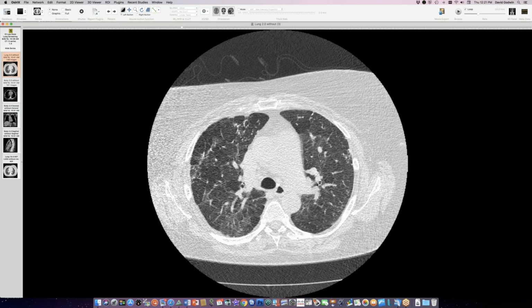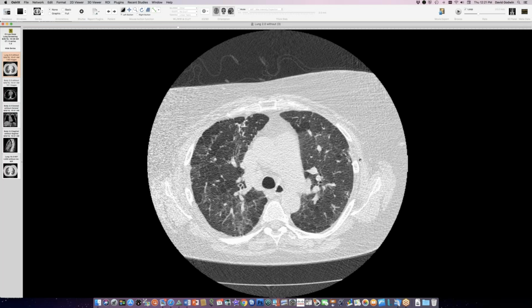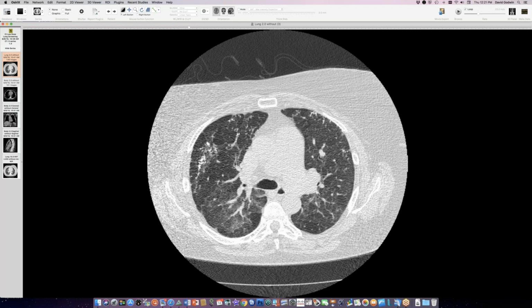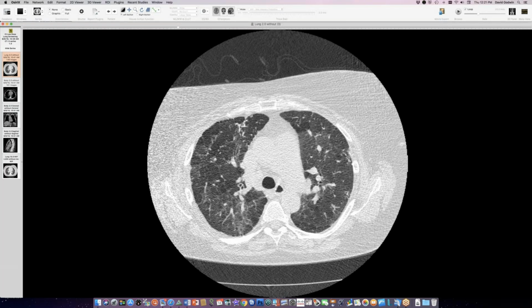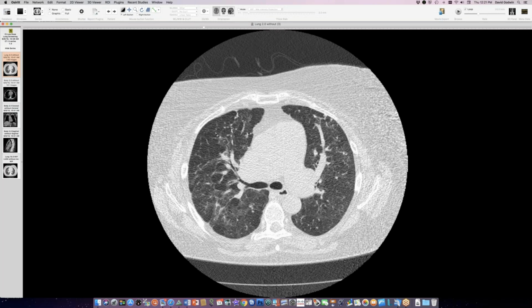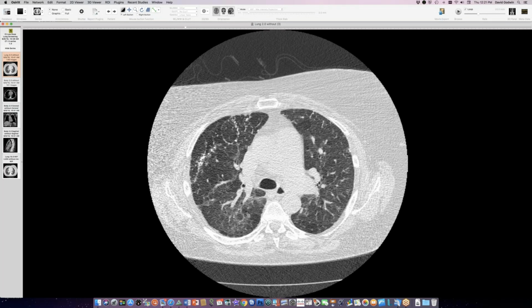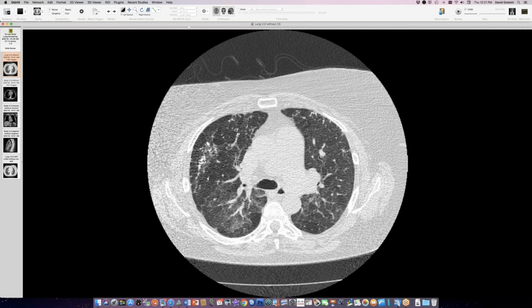This is messier looking than that case that Howard was showing. Some of these are subpleural against the edges here. I believe that this is probably low-grade silicosis from her construction work on sites, breathing dust like cement dust, and being around when people were jackhammering concrete slabs. So she has worked a long time in construction.